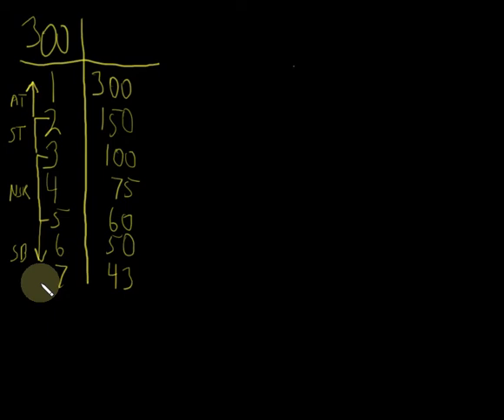If I give you a couple of beats, I might ask you what's the approximate heart rate of these two beats and try to get you to use another method to determine the heart rate. But this works if the heart rate is regular. Now, while this is not very accurate, we can be much more accurate if I did this, how many small blocks went by per minute.